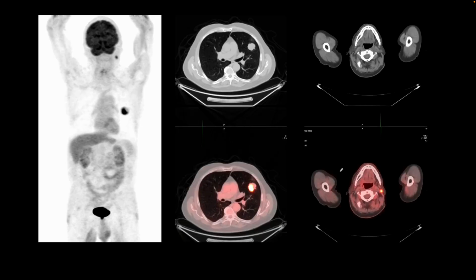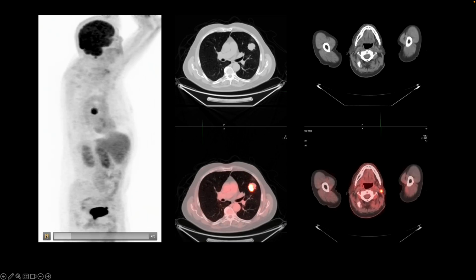This is our first patient, and they came in with a history of a lung nodule, and a whole body FDG PET CT was performed for evaluation of the lung nodule. Let's start by looking at the rotating image.